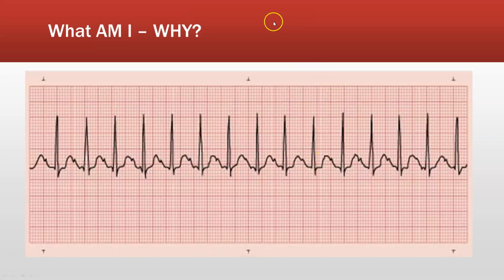Same, everything here, even if I took just what I recognize as my PQRST, if I lay that over the next one, I know that it's still skinny. This one's tall and skinny, but it doesn't have to be. There's PQRST, the heart rate's between 100 and 150. It is a sinus tachycardia. Treat the underlying cause. That's really it. That's all we have to do for those sinus rhythms. You should be able to very quickly determine if a rhythm is a sinus.